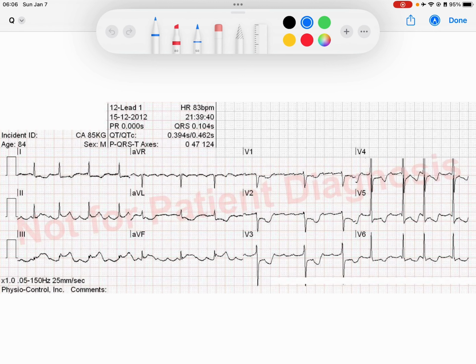So let's get started on this EKG. This is a really fun one. We're going to start off by doing what we always do and just get a vibe of what's going on. I'm going to look here at the bottom of this strip and we'll see we've got these QRS complexes occurring. They seem to be pretty regular, a little bit of an earlier beat there, and we've got a longer pause there, and then back to something, a little bit of a pause here as well, and longer, and then we see it gets shorter again, especially right here.